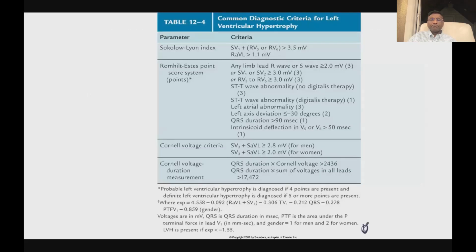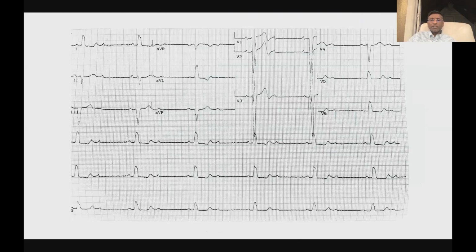I think that was just a reminder on hypertrophy. Okay, well, good job. Thank you for taking that one. And I appreciate everyone being sporting and taking on the EKGs. So let's go with this one. Shreya, would you take it?